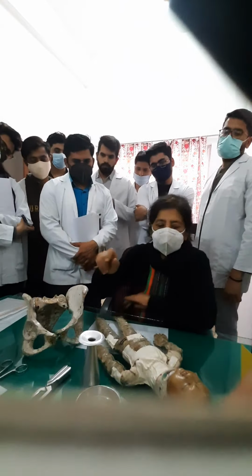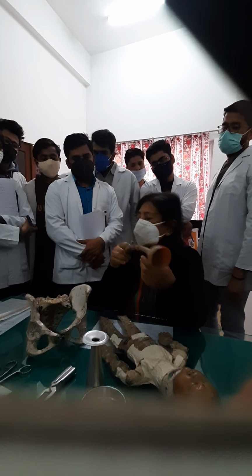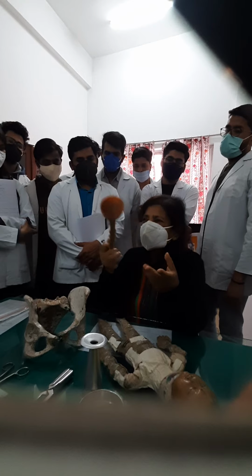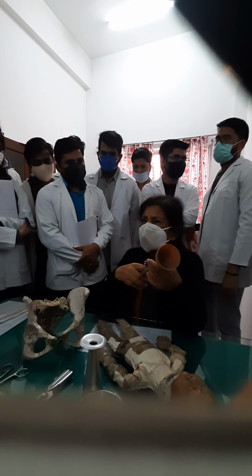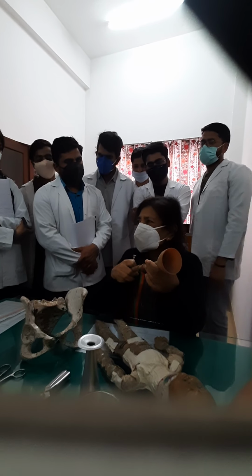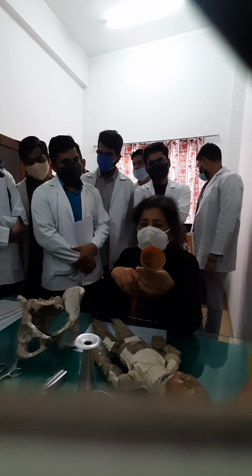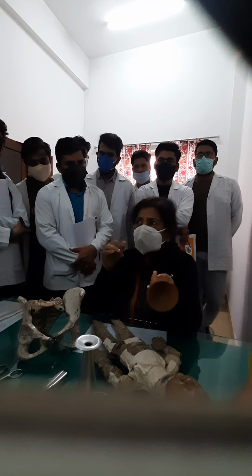And this is vacuum. Ventouse, okay. And then what is this made out of? What is this? Is it metal? Then what is this? Huh? What double valve? Who is saying double valve? Just saying stupid things. What is this made out of? Huh? Yes. Okay.